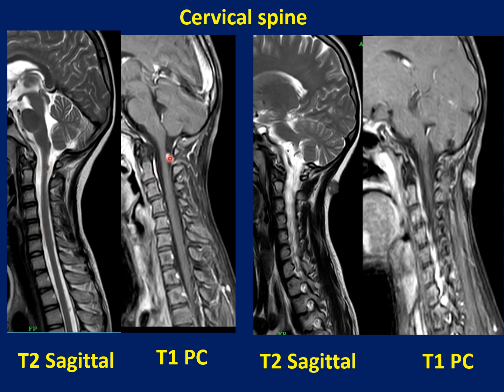This particular mass lesion is better visualized, which is sitting on the pial surface of the cervical spinal cord at C2 level, again showing homogeneous post-contrast enhancement, and it is showing a T2 hyperintensity. More laterally in the subcutaneous fat, again we are able to see a well-defined lobulated soft tissue mass lesion which is seen in the subcutaneous fat, showing homogeneous post-contrast enhancement.